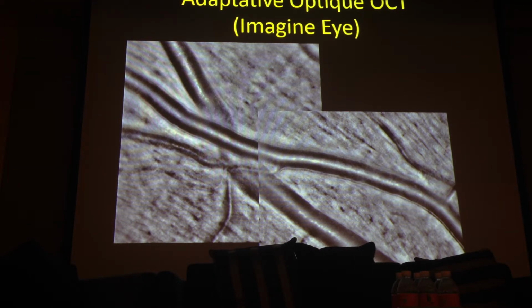And now they plan to follow patients. The problem with this kind of images is we have a very thin focus zone, and we don't have a very large exploration. So when we know that there is a problem, we can use this focus and this very high level follow-up of patients on a specific area. Probably a combination of these images and OCT angiography will be another way to develop our knowledge of this part of the exploration of the eye.